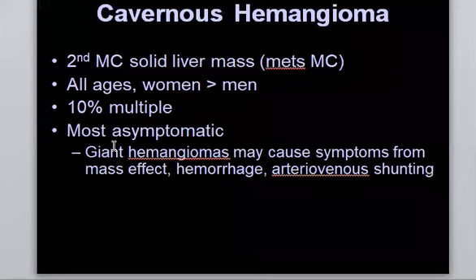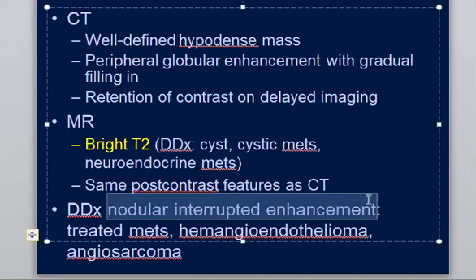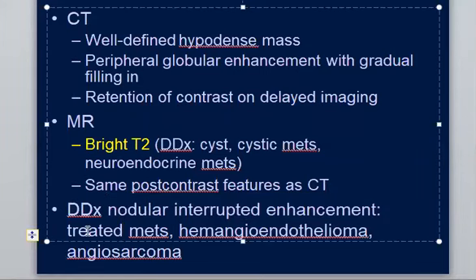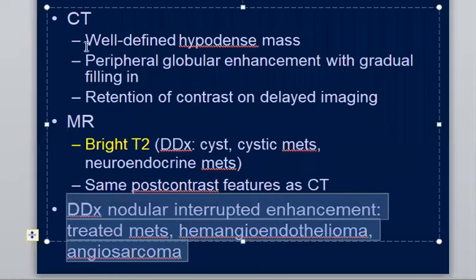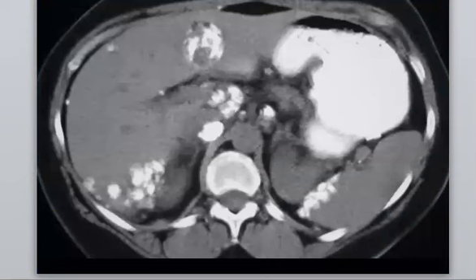Okay, so yes, it is easy to mention that it is typical for hemangiomas, but metastases don't always follow the rule. So we have much trickier cases, and finally it is metastatic. They mention in the textbook that it should be interrupted and should be like this, but to be honest, in the practice, don't rush for the hemangioma, because sometimes metastasis looks like it. Okay, let's go to another case, which is differential.